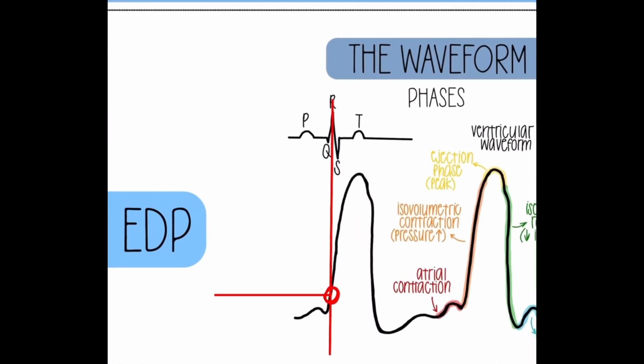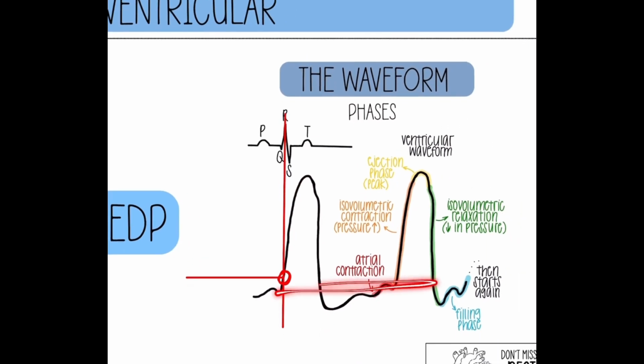And then beginning diastolic pressure is here. Now, I know in order of this waveform, it's kind of backwards because you measure end first and then you have beginning at the end of the waveform. But if you had two back to back, it wouldn't make sense. You'd go, okay, this is systole, this is systole, this is diastole. So beginning diastolic pressure is here, and of course, end diastolic pressure is over here. So I would just estimate beginning in that area.